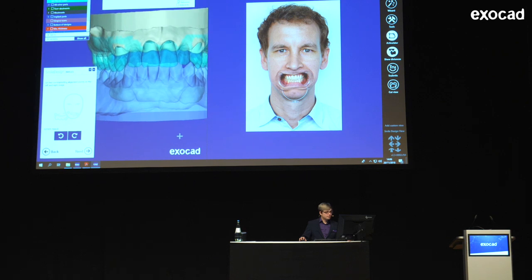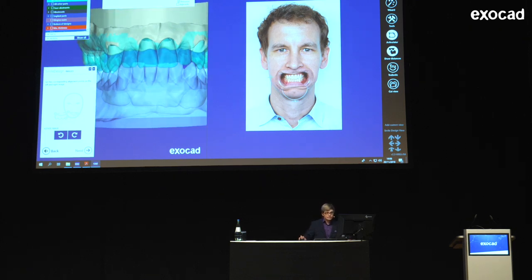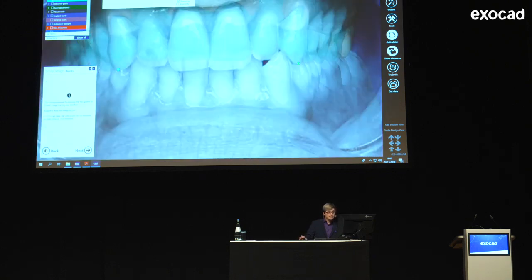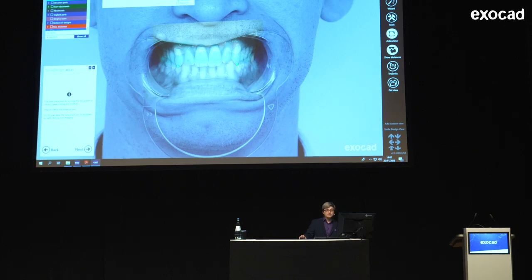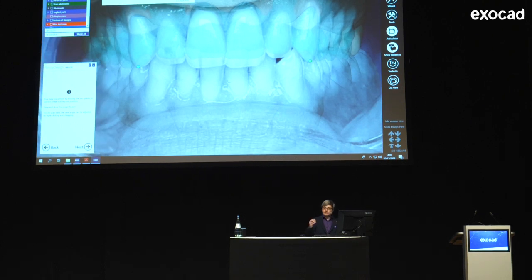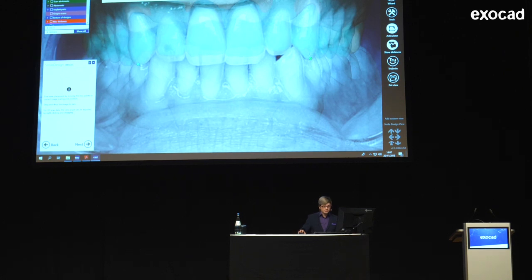Now I have to draw some corresponding points at a 3D model and at a picture. You've seen this process yesterday. And a small tip is the further apart those 2 points are, the better the picture will match the model in the end. I can still drag those points around if I ever make a mistake, click by accident anywhere else. And if I've done that, I'm pressing next. And now you see the overlay, the model behind the grayed out picture. It's a bit hard to see. You have to learn to get a view for that, actually. But after 2 or 3 times, I think everybody really gets it.